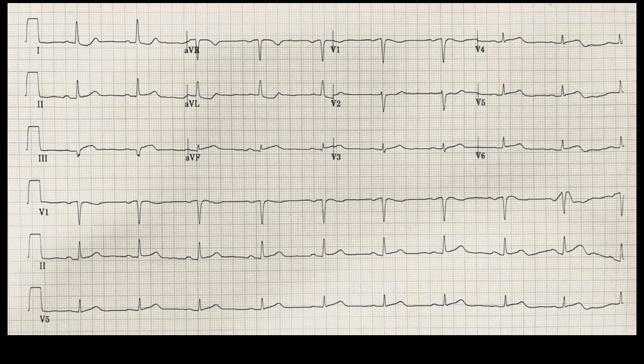And then we see sort of the same thing here again, a little tiny QRS complex, but that looks like it is truly elevated above the line to me. So we've got what appears to be significant ST elevation, or at least characteristic looking ST elevation in lead 3 and AVF. We have ST depression on the other side of the heart in lead 1 and AVL. This looks like a STEMI to me. This is one that I would call activate the cath lab. Yep, this seems like the real deal, even without looking at the patient themselves.